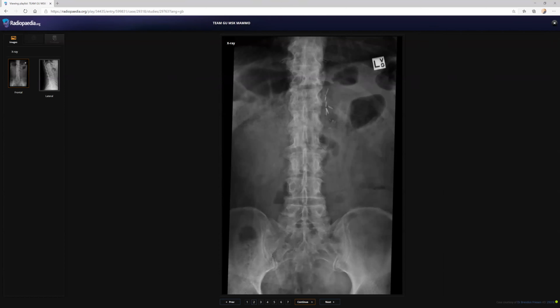Okay, see, this is an X-ray frontal projection, predominantly showing the bones. I can see some clips around D12 on the left side. There are some lucencies seen at the level of the pedicle of D11. So I just need to look for the clinical history of the patient and review some previous films available, and the labs.